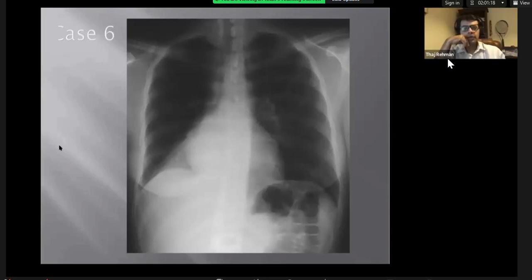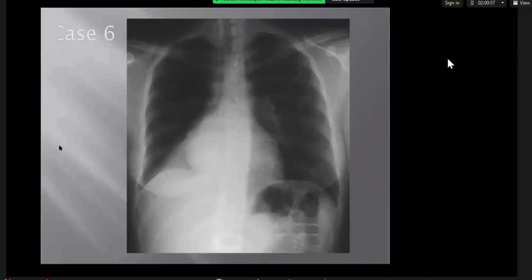Good. So you have picked up the findings. Can you arrive at a diagnosis? Give some idea what might be going on. You did describe all the abnormality, mediastinal shift. I would have said there is tracheal shift as well, and then there is an opacity. Okay, it's some sort of collapse. Good. Because there is negative mass effect around this lesion.